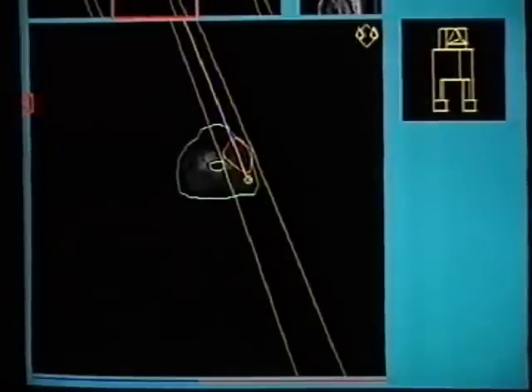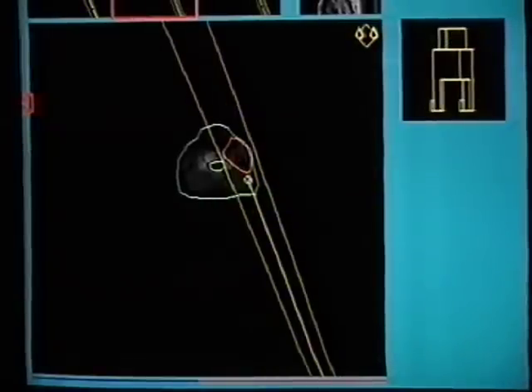A new radiation beam is created by pointing and clicking a second beam in the beam list. The multi-leaf collimator is defined in the same manner as for beam number 1.